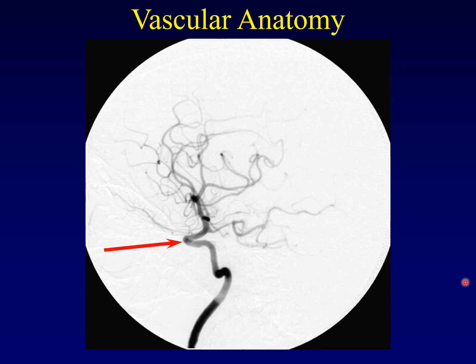This is to remind me to talk about the siphon. So what's this coming forward? What artery is this? It's a branch of the internal carotid artery, and it's coming right off of the siphon, and it's headed forward. That's our ophthalmic artery, and it's going to be feeding the eye. That's a reminder about the skull base.